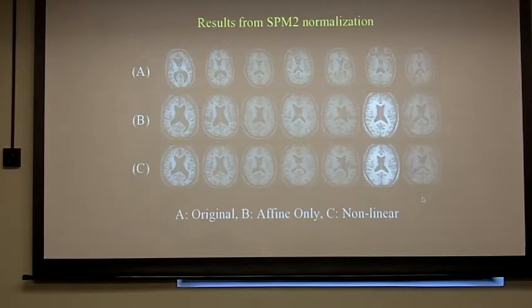And it looks like the nonlinear normalization component here didn't do much to improve the normalization results. So the intermediate conclusion is that this nonlinear normalization based on discrete cosine basis functions or polynomials, they all fail in dealing with severe diffuse injury.